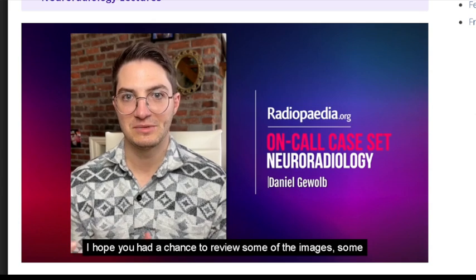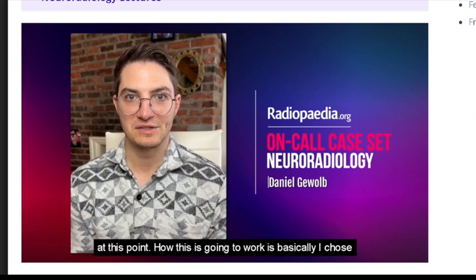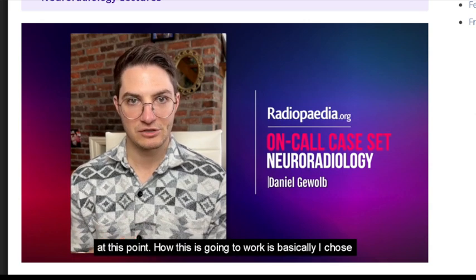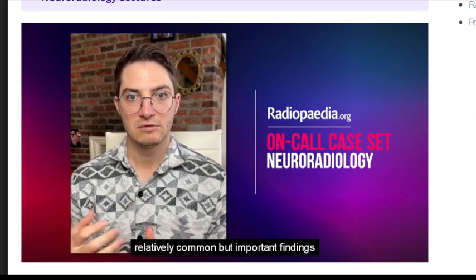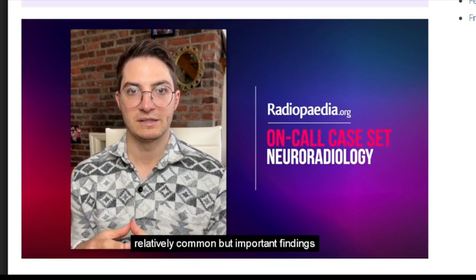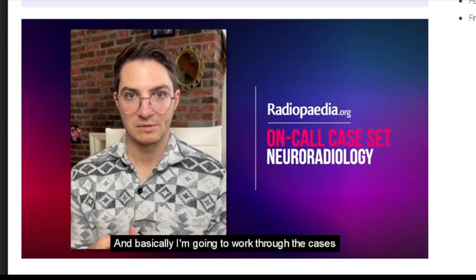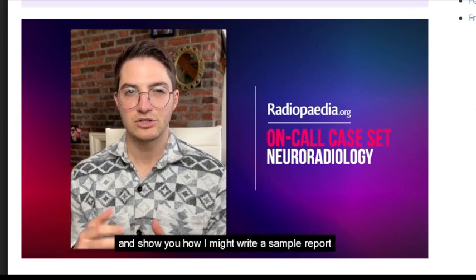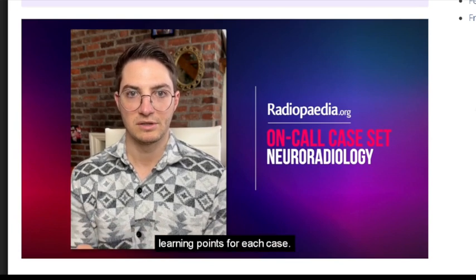To review some of the images, some of the cases, and maybe even make sample reports for yourself at this point. How this is going to work is basically I chose 5 cases that you might see on call that are relatively common but important findings, and a little bit of challenging cases. And basically I'm going to work through the cases and show you how I might write a sample report, and then also go through some important learning points for each case.